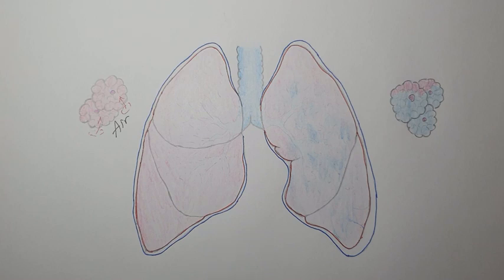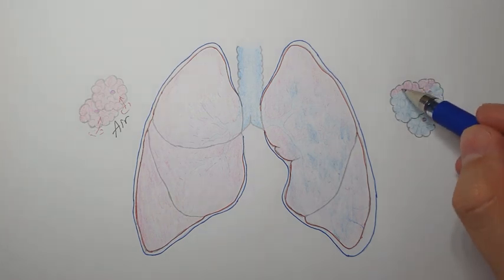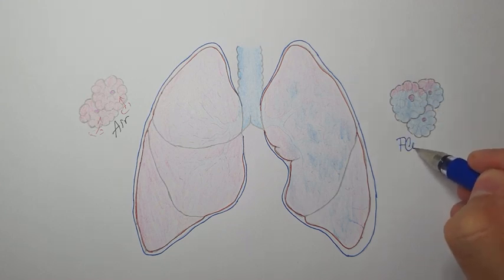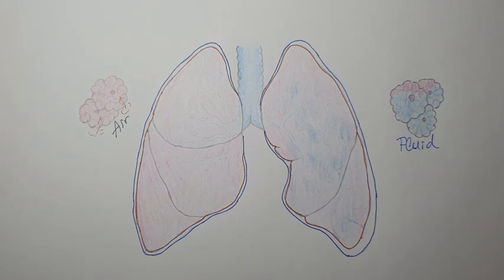And because of that, we see here that the alveoli are no longer filled with air; there is a small amount of air, but in the alveoli there is fluid. So fluid in the lung tissue or in the alveoli is actually pulmonary edema, or it is also called pulmonary congestion. One of the first signs are so-called Kerley B lines.